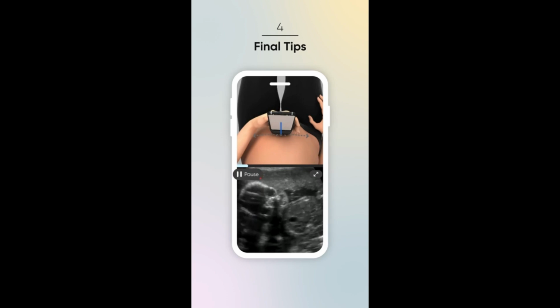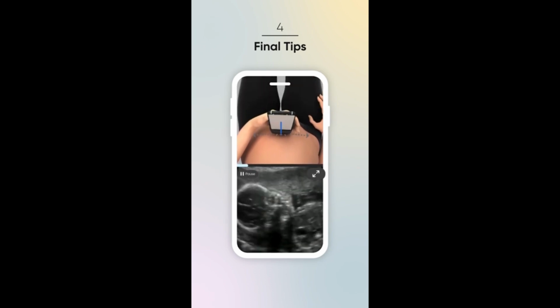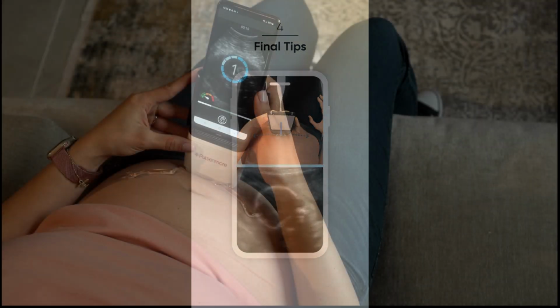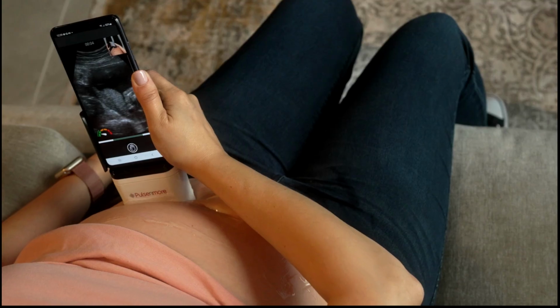Patients can self-scan independently without clinician assistance. The process takes approximately 3 minutes. After completion, the scans are automatically uploaded to a secure cloud for offline clinician assessment. This mode is ideal for regions with limited prenatal care and internet access, as it requires only a minimal internet connection for a quick fetal well check.